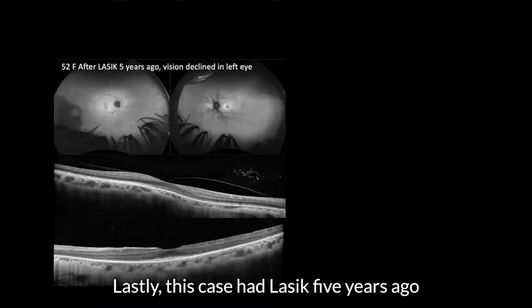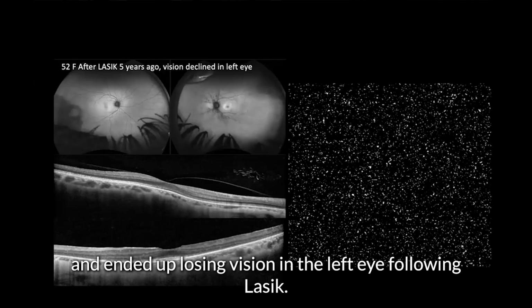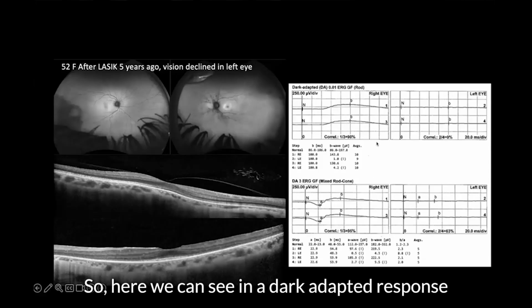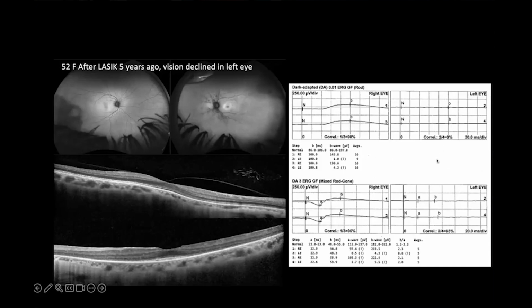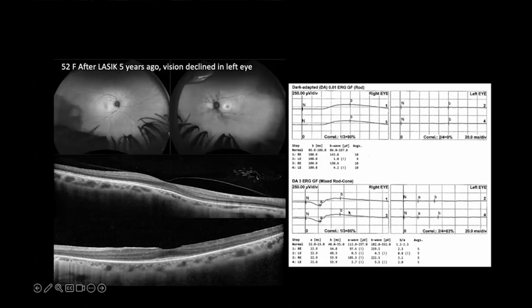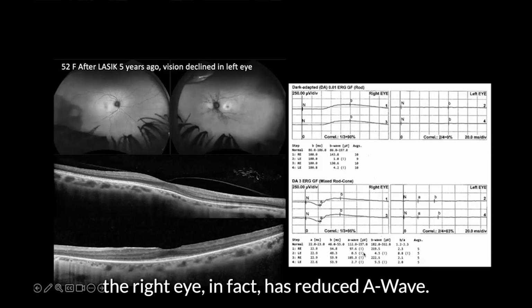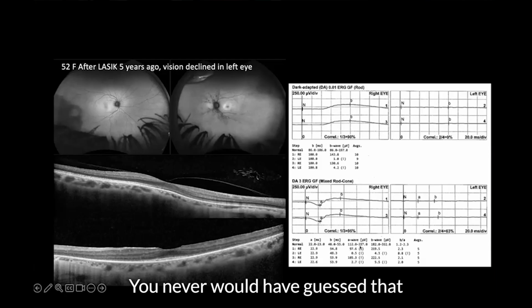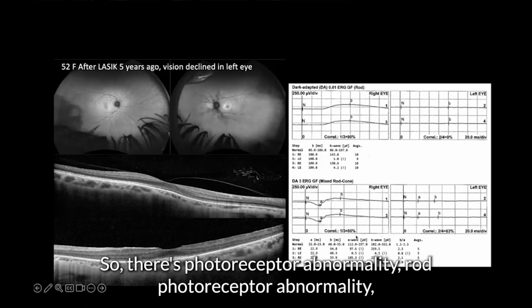Lastly, this case had LASIK 5 years ago, ended up losing vision in the left eye following LASIK. So here we can see in the dark adapted response that there is severe attenuation of the B wave. However, if you look closely in the right eye, which she's asymptomatic in, in fact, she may even be needing surgery soon for her cataract. The right eye, in fact, has reduced A wave. Now, you never would have guessed looking at the OCT or the autofluorescence that she's got a reduced A wave. So there is photoreceptor abnormality, rod photoreceptor abnormality.